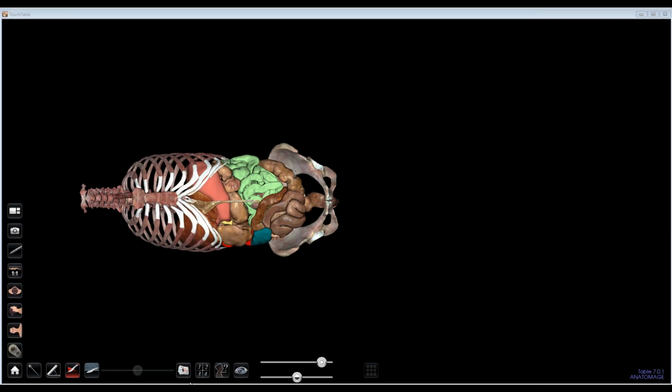And then there's only really one other thing I wanted to show in the physiology section. Give me a moment here.